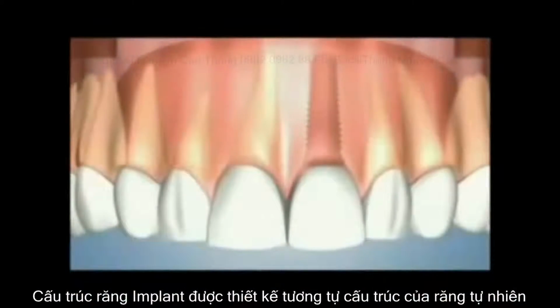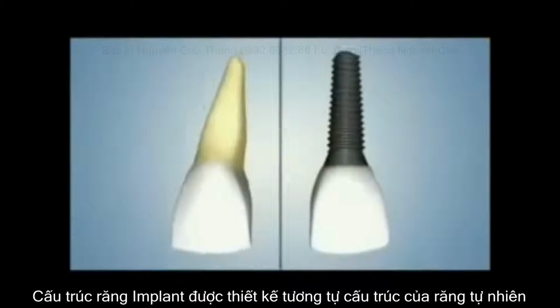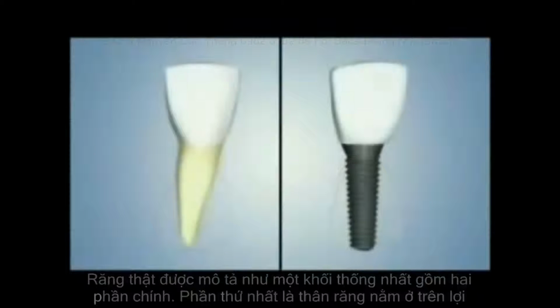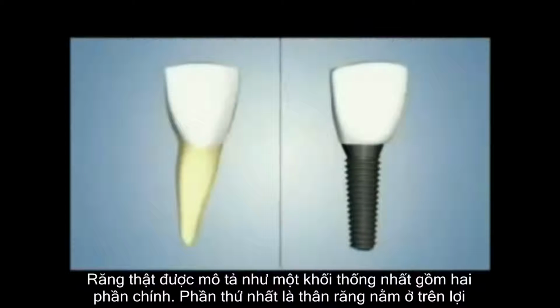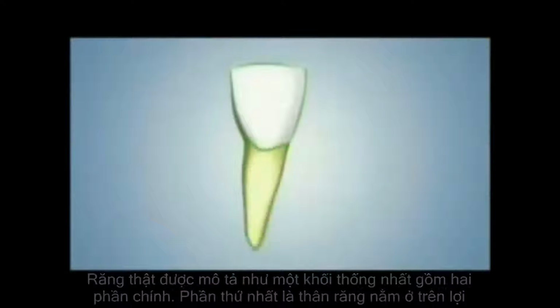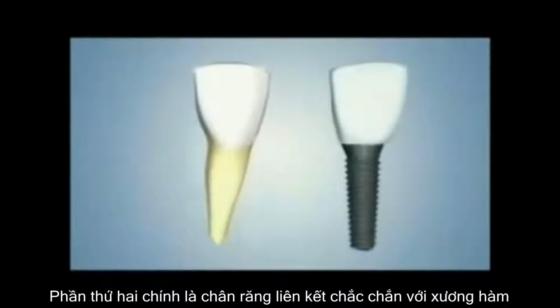The design of a dental implant is based on the design of a natural tooth. A natural tooth is one piece commonly described as having 2 main parts. One part is the crown that sits above the gums. The second part is a root that sits securely in your jawbone.